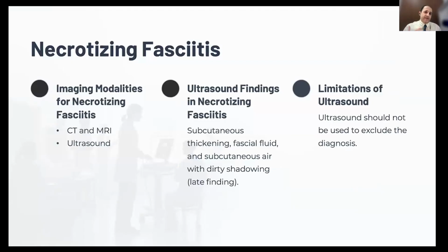Another very important and critical soft tissue infection is necrotizing fasciitis. Can we diagnose necrotizing fasciitis with ultrasound? Firstly, we don't do ultrasound to rule out necrotizing fasciitis, so we should not think about that. We do ultrasound in a case suspected of necrotizing fasciitis to find something that supports this diagnosis, not to rule it out. We need to keep this in mind.